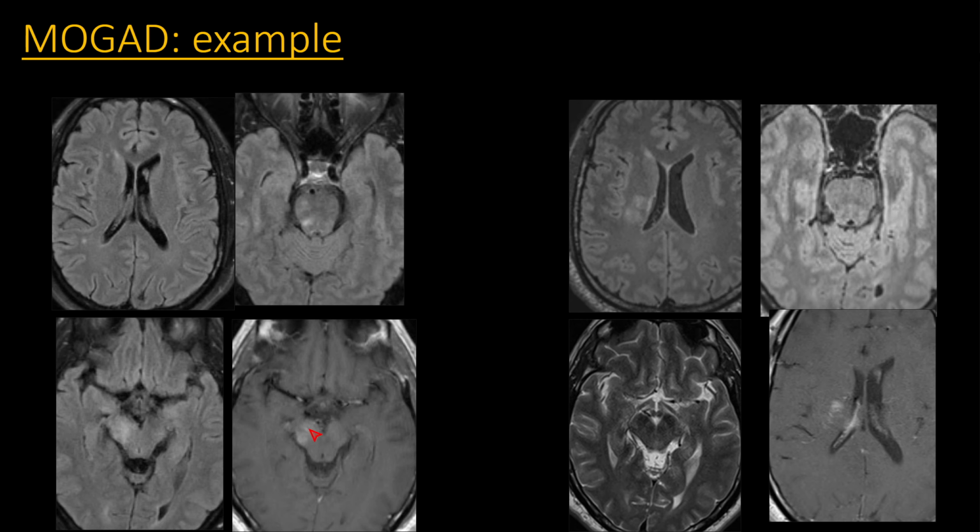There's some enhancement. You can see the enhancement and the lesion itself, they're pretty ill-defined, sort of fluffy looking, not quite what you would expect with MS, with those round, ovoid, flame-shaped lesions. Then I'm just showing here for the sake of the follow-up.